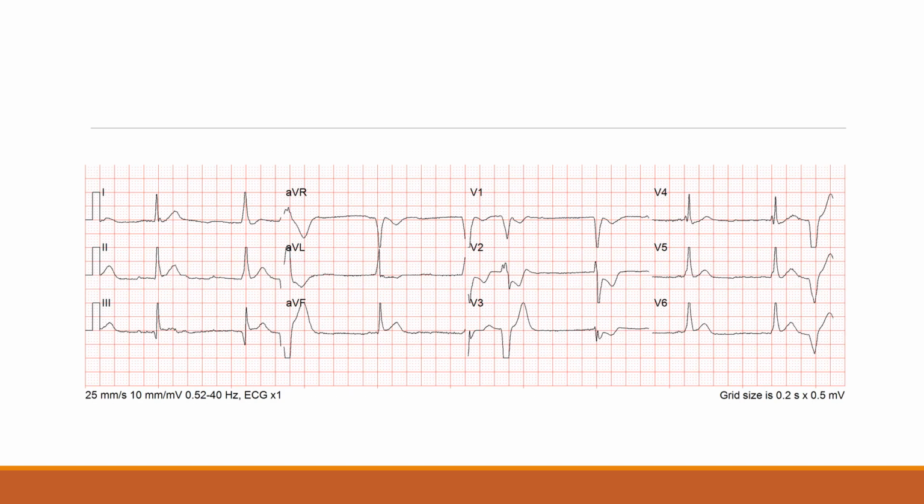All right, so another example here. In this case, the patient presents with chest pain, hypotension, bradycardia. We get our EKG, and hopefully your eyes, there's a lot going on here. Your heart rate is slow. We see your P waves are not regular. Your PR interval is changing. Most likely a complete heart block. We see some ectopic complexes that are wide and don't have any P waves. So those are PVCs.